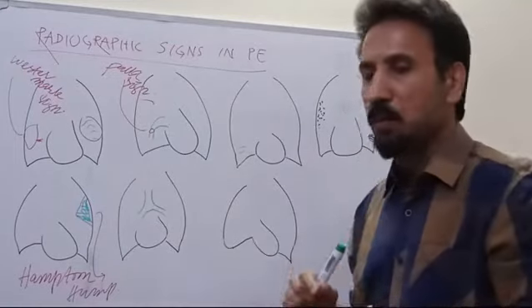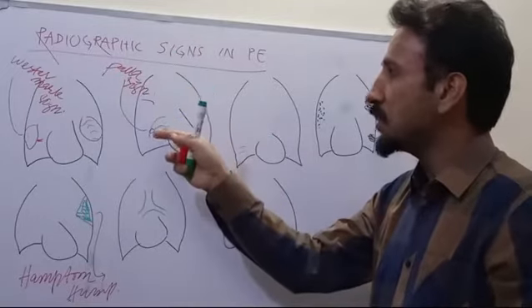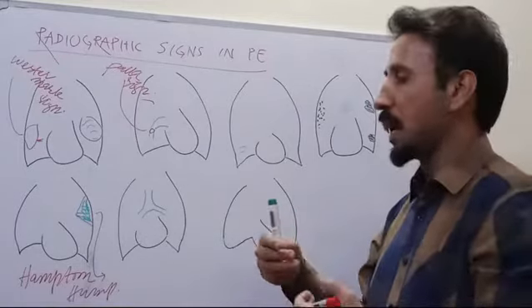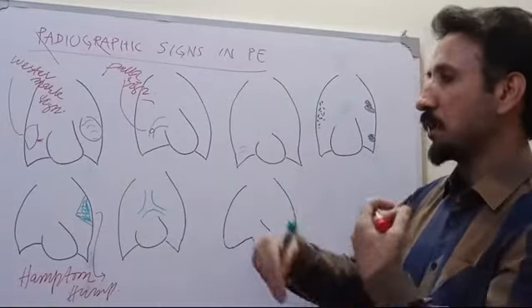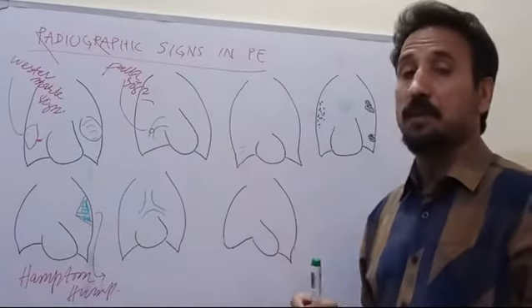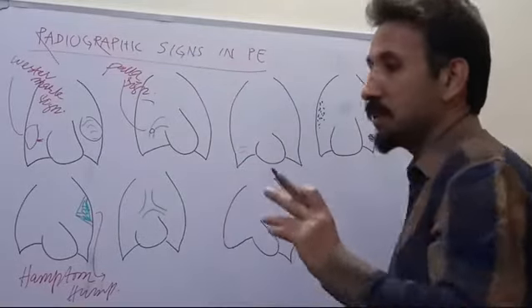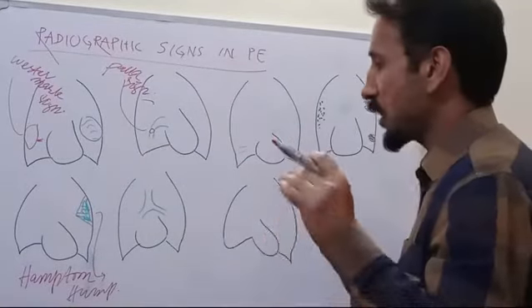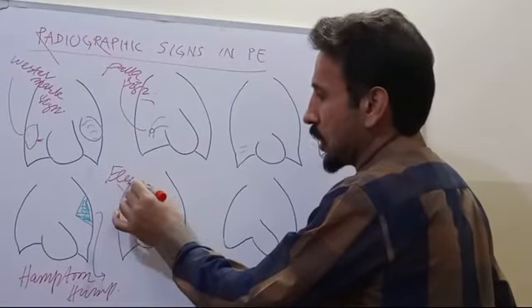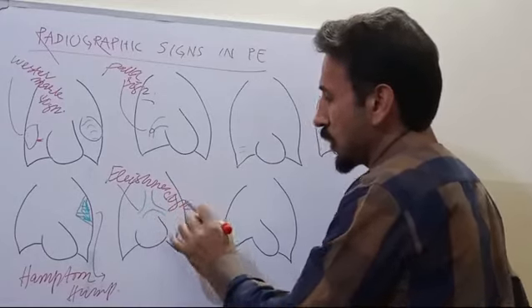But the right descending pulmonary artery traverses through some part of the lung parenchyma, which gives a black background, so its dilatation can be appreciable. So in the Fleischner sign, the pulmonary trunk is dilated.